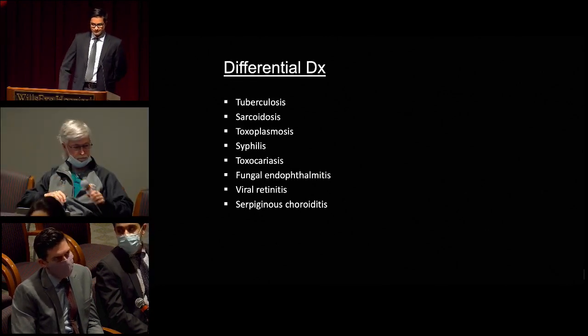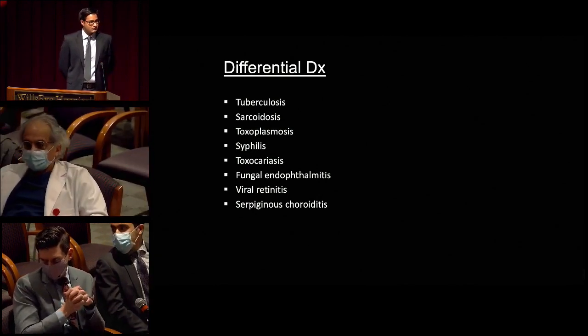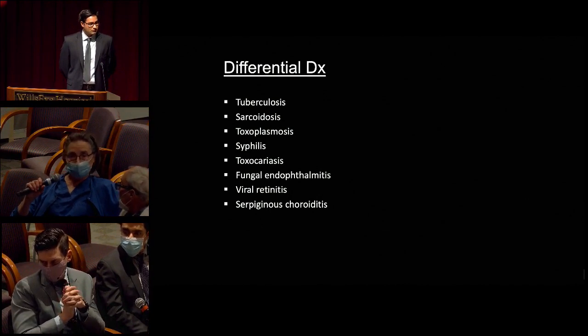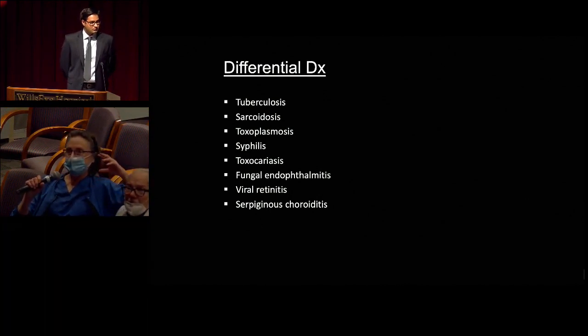Other things to consider, neoplastic lesions. But with the vitritis, it's not likely to be neoplastic. But the ones that you might consider would be a hemangioblastoma, but they're not as yellow as your picture showed, and an astrocytic hamartoma, but it usually doesn't cause exudation, though astrocytoma can lead to exudation. So you just keep that in mind, even though I do think this is inflammatory or infectious. Thank you.